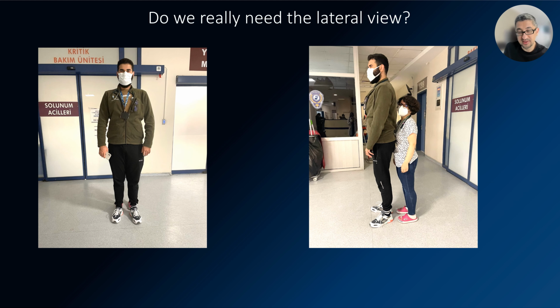Do we really need a lateral view of the chest? Well, routine lateral views are not recommended in the pediatric population due to an additional dose, because the dose is higher than the frontal projection due to increased body thickness. Also, the interpretation of the lateral X-rays is challenging. Having said this, it is really a good idea to get a lateral view and to get rid of superimposition.